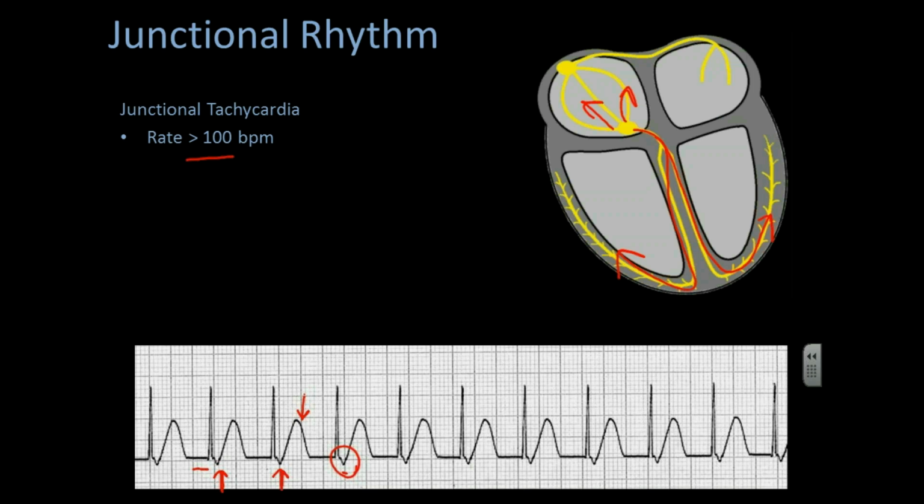Now the rate, let's check the rate of this. Looks like we have, it's just slightly less than 3 large boxes. So I'm going to go ahead and say 2.9 large boxes.